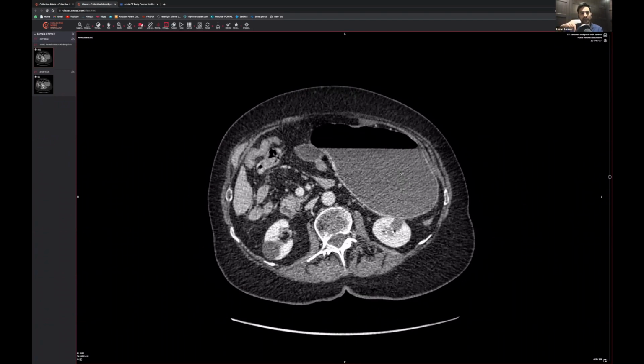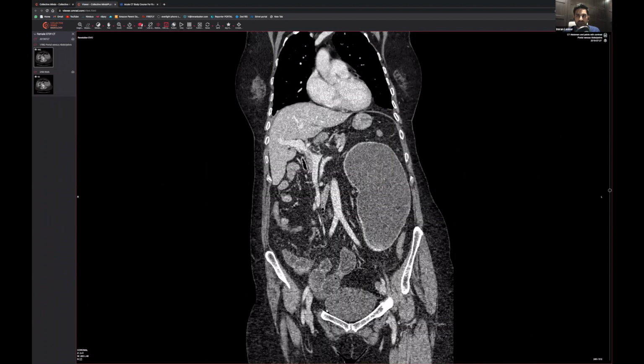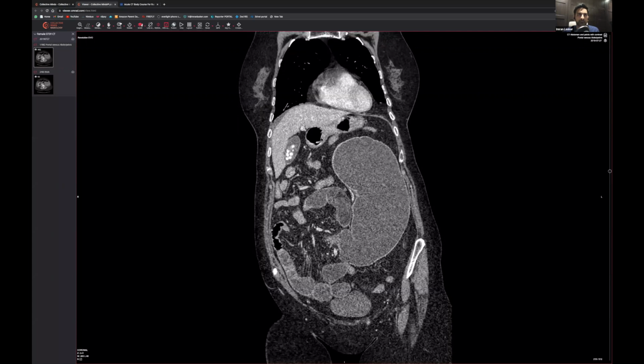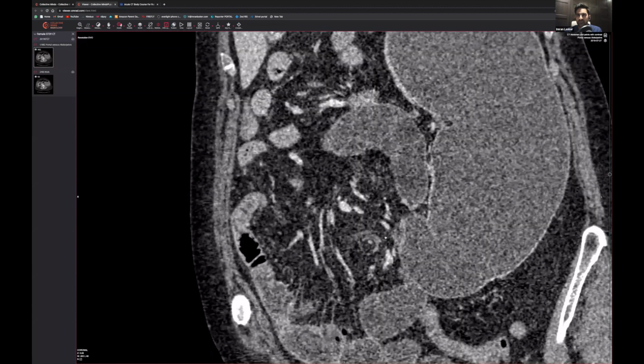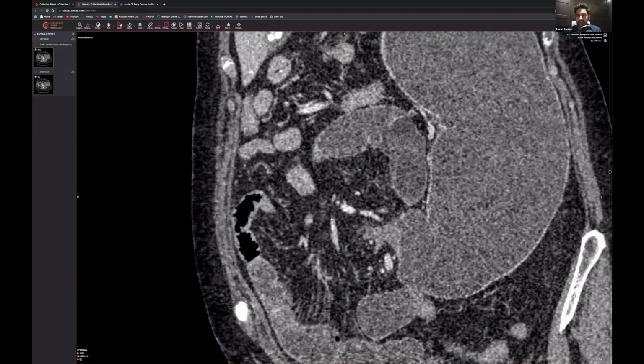So you can see how using these principles, you go, okay, gallbladder, is it the pancreas? Is it the kidneys that's causing the pain? If there's none of those things, you want to see on coronal again. So I'll go back onto coronal. This is the big viscus that we had, and we thought that was the stomach. Then as we come to the bottom end here, I'll zoom in. Can you see that around this point, where it almost feels like a stomach pylorus, there's a bit of a twist here? And then it continues into that bowel.